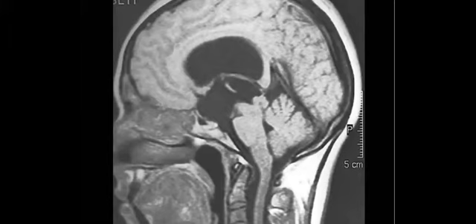Aqueductal stenosis. Why? Causing hydrocephalus. Suprasellar arachnoid cyst. Supratentorial. Yes, it is a third ventricle aqueductal stenosis, but you should mention the level. Where is the level? Yes, to give you the key: the third ventricle, do you see the floor of the third ventricle and the appearance of this bowing?